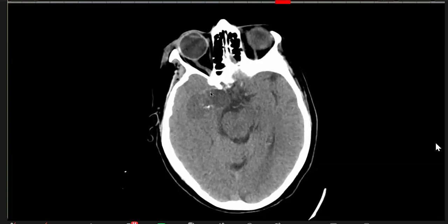Madam, excuse me. You see, in the exam, you don't do this. You don't point out lesions. You speak what you are seeing. You cannot do this, that I am looking at this and you point out that this is the lesion. You describe it. Over to you. Don't use your mouse unless it is needed or it is asked.